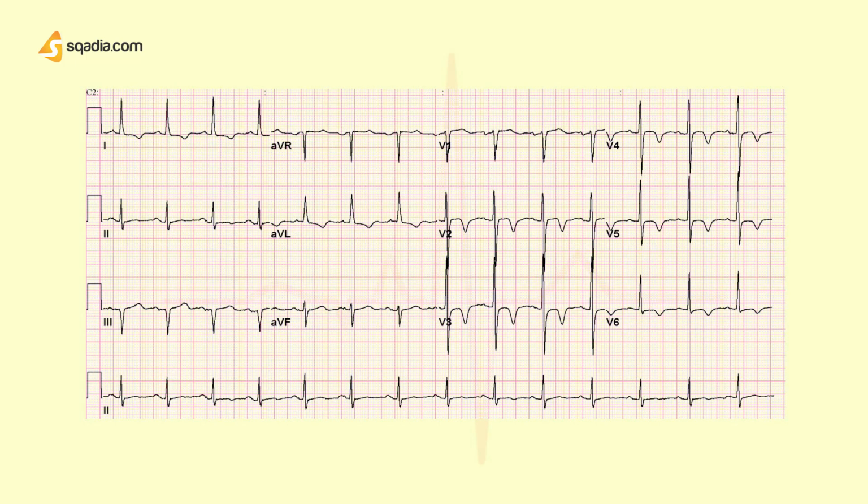Now that we know what each wave represents, let's look at a typical 12-lead ECG. Now these are the 12 different recordings, which can be a little overwhelming to look at first, but give us a chance to make this the easiest thing you will learn today.